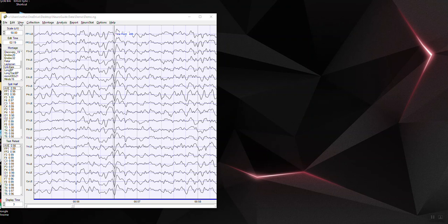In this case, we are looking at an individual. Here is our demo patient who suffered a right parietal lobe injury. He, as many times I've described, has spatial neglect and is paralyzed on the left side.